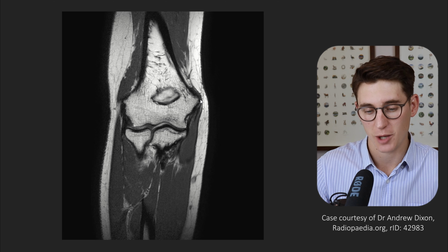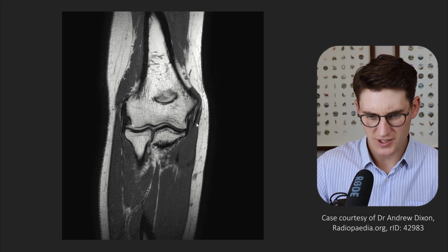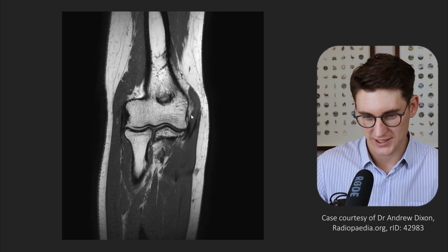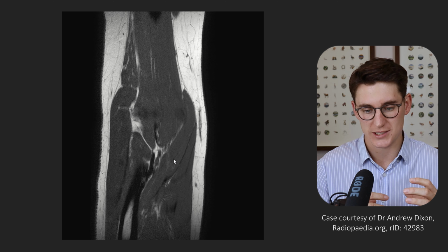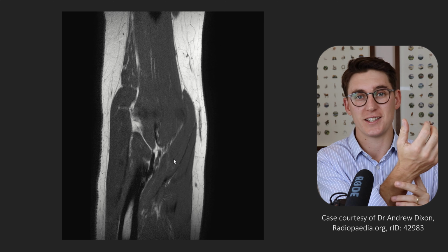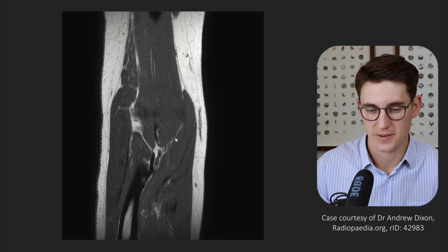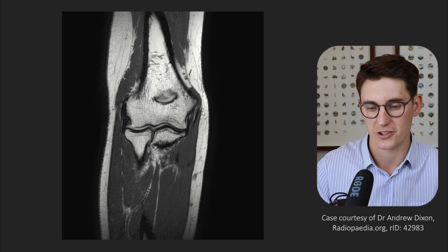So you can see a tendon coming from the most medial part of this medial epicondyle, and that heads off into our flexors of the forearm. We can see this muscle wrapping around here, our pronator teres, teres meaning round, it's our round pronator. That means we've got another pronator which is more distal in the forearm, which is our pronator quadratus, our square pronator. Pronator teres is the first one that's coming off that common flexor tendon origin here.